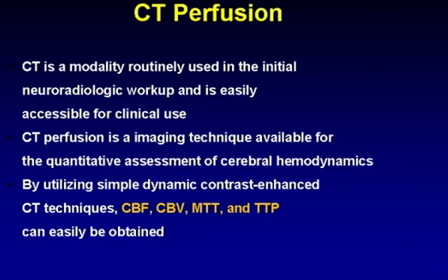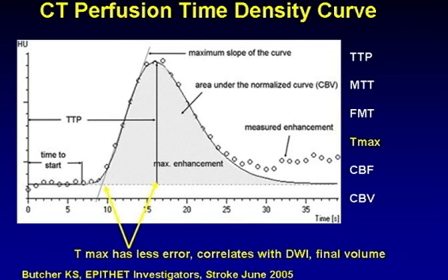If you were to use CT perfusion, there's some work now, and this is really for people who are interested in imaging stroke. All these metrics, as I've mentioned to you, are all very controversial. There was a paper in Stroke from June this year where they were looking at some newer metrics. One is called Tmax, which is the time between the start of the bolus to the peak of the bolus, and people are finding now that this may be a better measure of the penumbra or tissue that's at risk. So just be aware of that, and be aware that a lot of these parameters, time to peak, mean transit time, that you're deriving from your CT perfusion software are prone to a lot of issues and limitations when it comes to the post-processing.